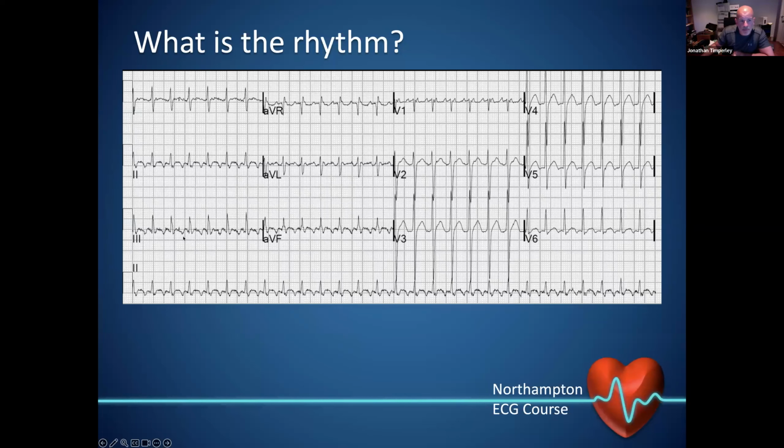This is just a typical counterclockwise atrial flutter, and over here in V1 we can see the organized atrial arrhythmia. But when we look in lead 2 we can see we never have a true isoelectric stable period. Everything is continuously moving, and it's just that the second beat of the atrial flutter goes through the QRS.